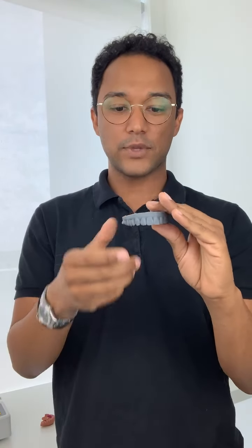When you're applying an intraoral scan onto the picture and you design over it, you are literally just designing the frontal part of it. This is why when you are designing a Smile with or without an intraoral scan, be aware that you are designing a Smile only based on a frontal picture, a frontal view of the patient's smile.